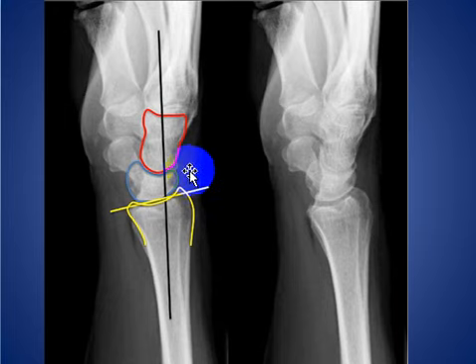The distal articular surface is angled about 10 to 15 degrees anteriorly, and this is useful when identifying a subtle fracture at the distal radius, with flattening of this angle.